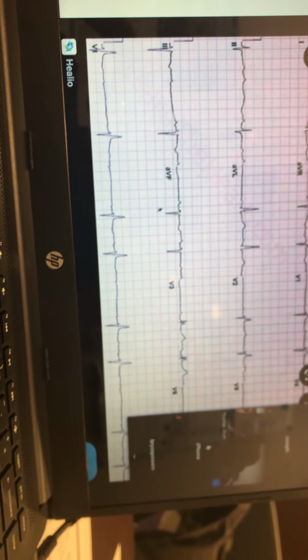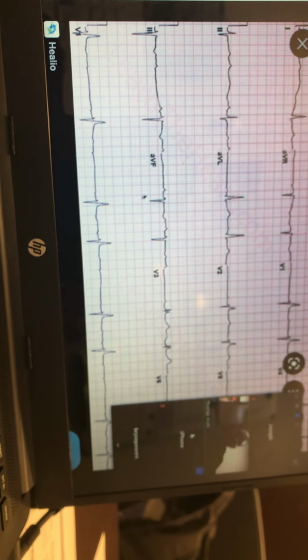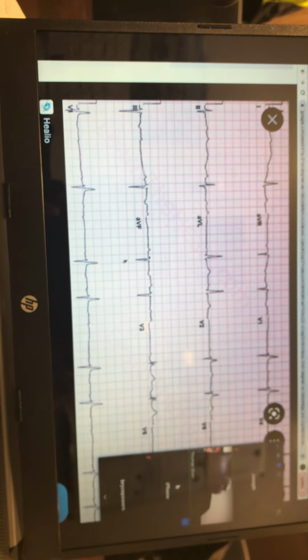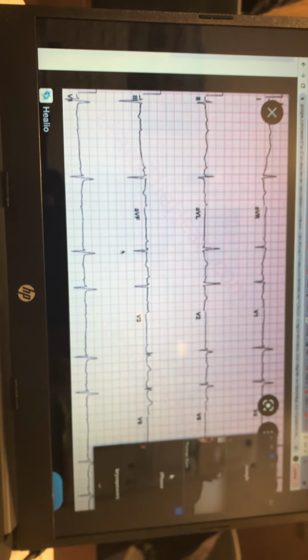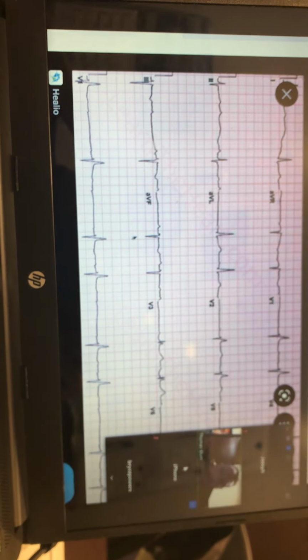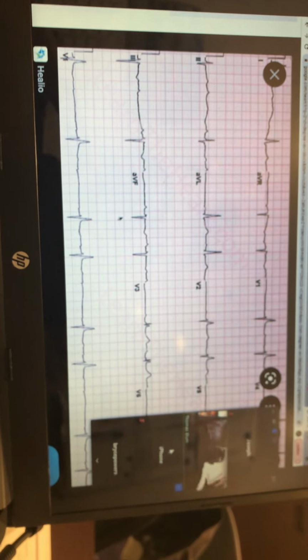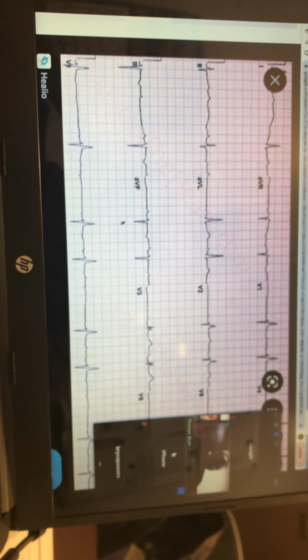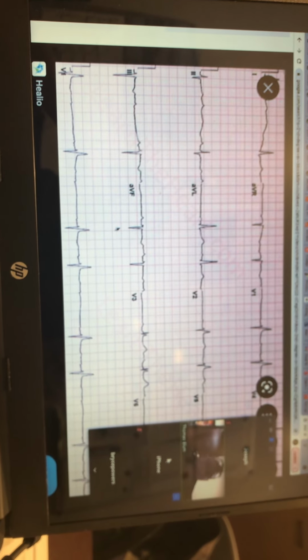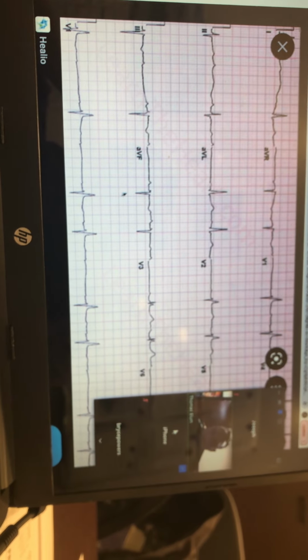And it looks like. Remember, let's follow that systematic approach, right? Let's go to lead 2. Let's look for our P wave. Let's identify if it's a sinus-based rhythm. If we follow that systematic approach, you're more than likely able to identify the underlying rhythm first. Don't just take this broad spectrum overlook, right? Because we're going to be sucked into so many different avenues. Start off identifying that rhythm, right? Find your P wave, locate your QRSs. Okay, use that systematic approach.